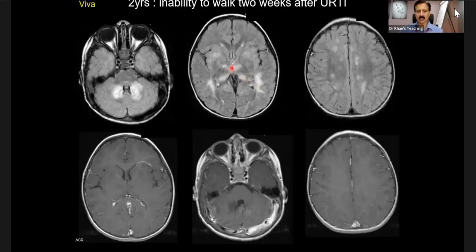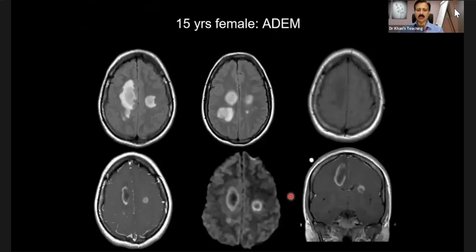Look at the thalamus here. This is involved. Look at the basal ganglia, deep gray matter. Look at the dentate nucleus here, deep gray matter. So this increases your confidence. Of course, this is a giveaway. Maybe the examiner will not tell you, or you might like to ask it. Please remember, in the real world, many of these patients, the history is too vague, and at times they just forget that they had something like this. Just to make a point that in ADEM, the lesions can be larger. They can again show enhancement, which can be horseshoe shaped like this.